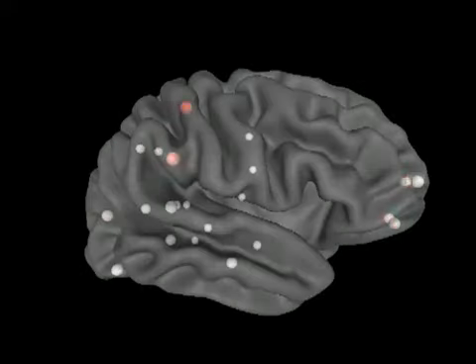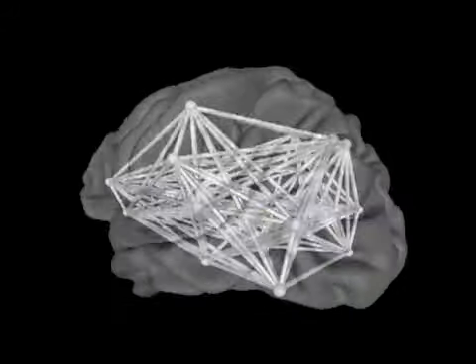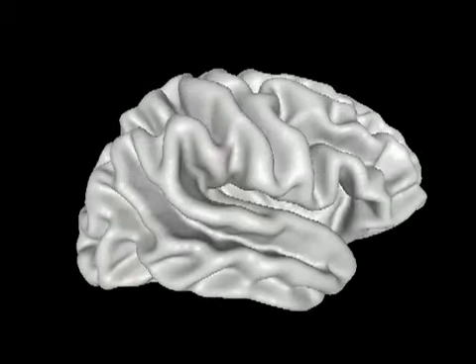onto the default network. And then we can look at coherence of that network as well. And this is the interconnections between the default nodes of the default network. And then we go back to the surface projection of the deviant electrical activity in that part of the brain.